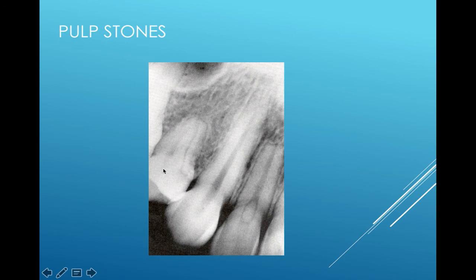So when I look here, I'm looking at mostly tooth number 5 and tooth number 7. So 5 I'm definitely concerned about because look at all the resorption here. There's barely anything left of that root. It's very shortened. So that is something I would definitely be concerned about. That tooth may be mobile. I'd like to see what was going on there.